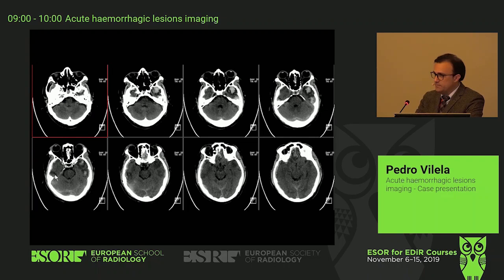And more. So we are looking at trauma. There are specific areas that we should look. So middle cranial fossa, temporal lobes, and what else? Who wants to help? Still on the intraaxial, still on the brain hemorrhage. Where? Bilateral frontal. This is very typical.